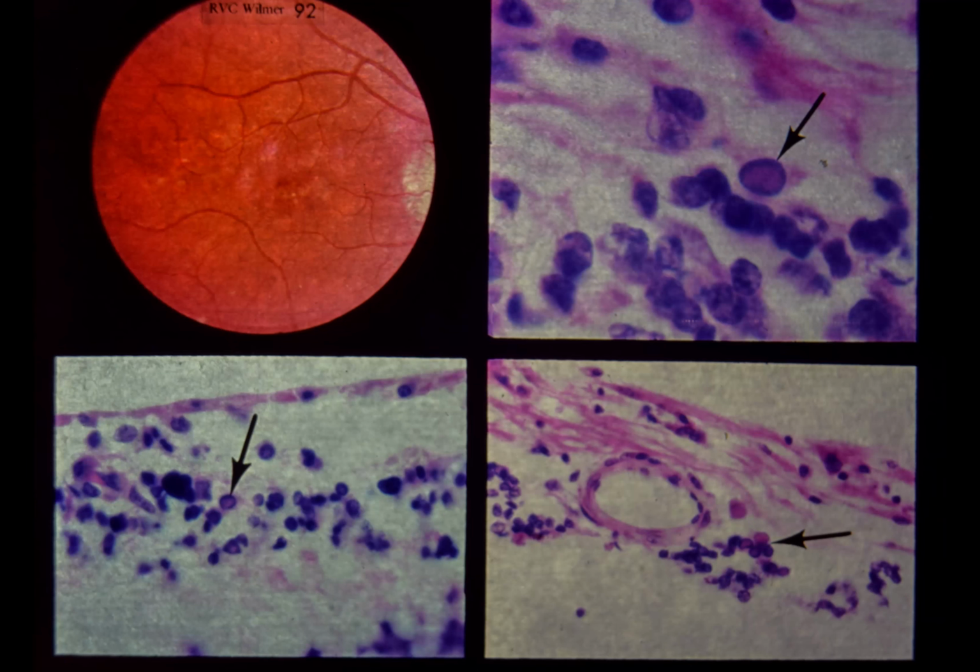Slide 92, subacute sclerosing panencephalitis. This 13-year-old female complained of decreased vision in her right eye. Visual acuity was 20/40 right eye and 20/20 left eye. She was otherwise healthy. Upper left, the right macula shows numerous retinal pigment epithelial abnormalities. 2 months later, the patient became confused and disoriented and began having seizures. She was unable to talk coherently.